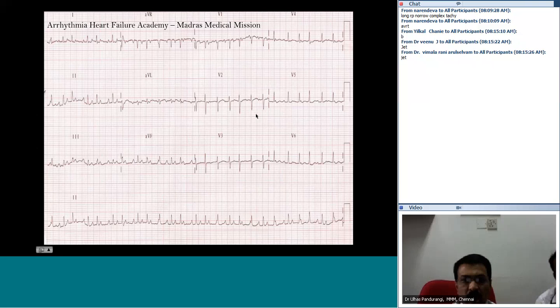A closer look at this tachycardia would reveal that it is irregular. So you are dealing with a pediatric tachycardia where it is irregularly irregular, a narrow QRS tachycardia in the pediatric patient. I will bring your attention to one more finding here, and that is you see P waves, and these P waves are more than the QRS. So in a baby who has an irregularly irregular narrow QRS tachycardia, if the P waves are not to be seen, it could easily be atrial fibrillation, one of the rare pediatric tachyarrhythmias.